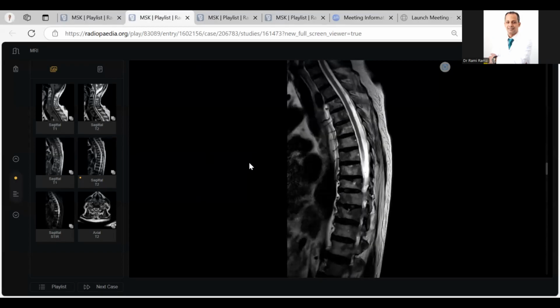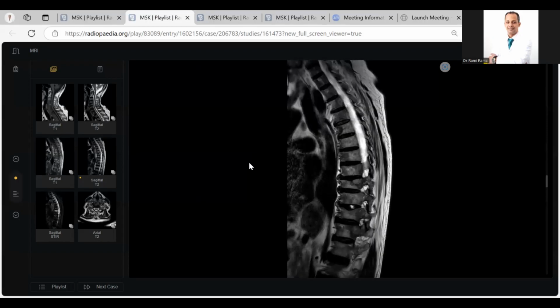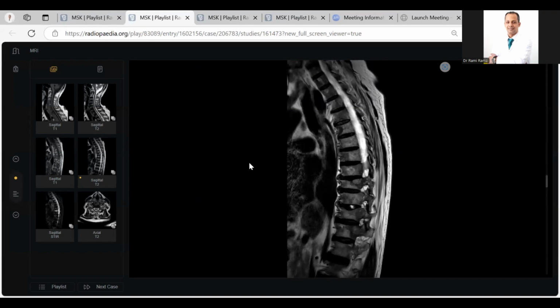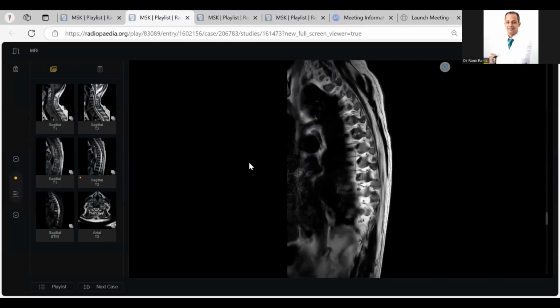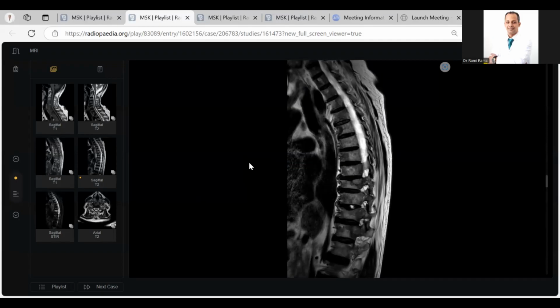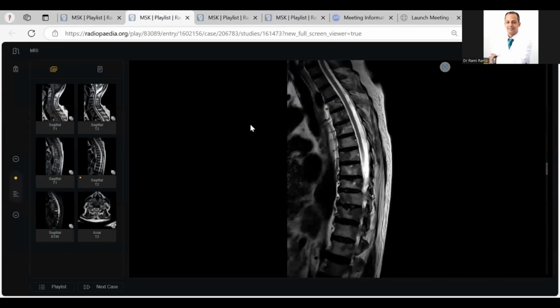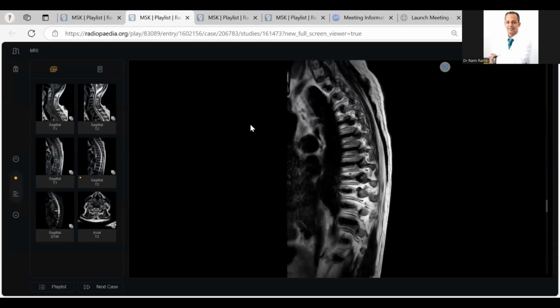You told some very good point. This low T2, so I'm thinking of osteoblastic or sclerotic metastasis. Sclerotic metastasis can also come from transitional cell carcinoma, neuroblastoma, medulloblastoma, neuroendocrine tumors. All of us know if female it is breast, if male the primary would be prostate. By the way, a PET CT is now used for prostatic cancer, but not FDG. It is a gallium PSMA PET CT.